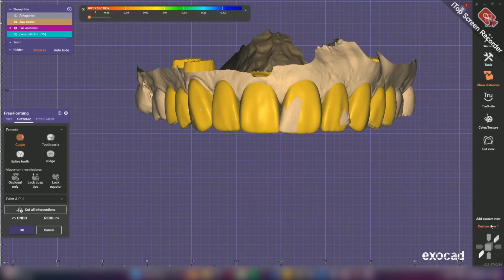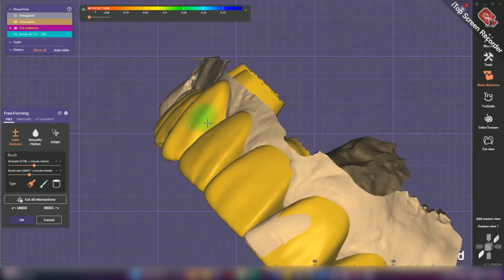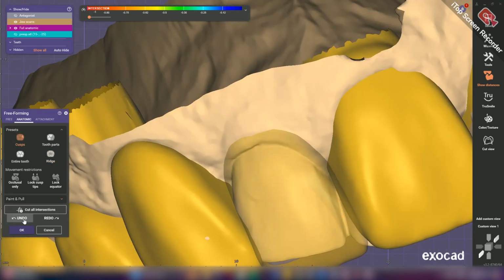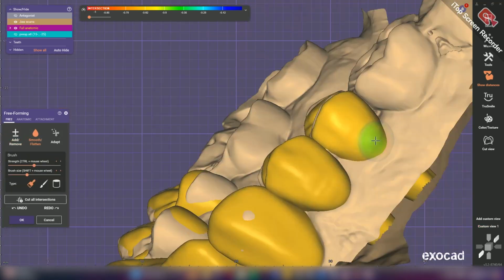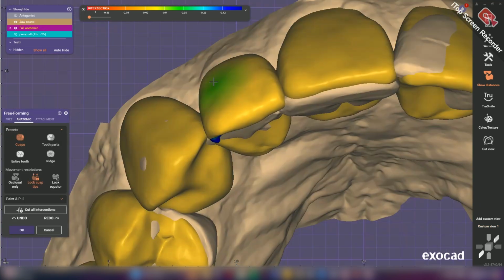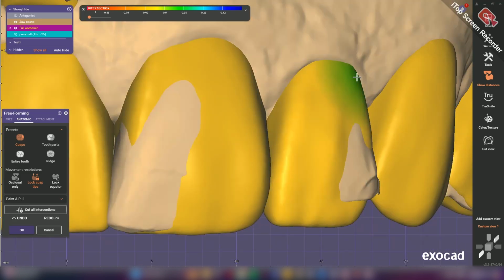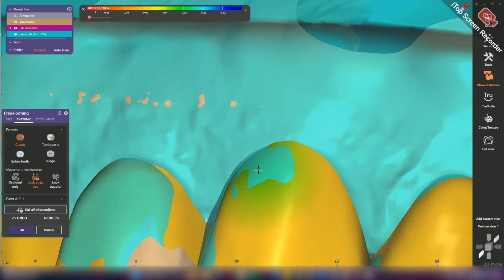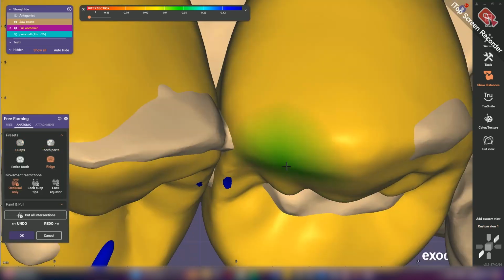Set the orientation view as facial view and see if there is anything missing, or to improve on buccal aesthetics, try to reduce the bulkiness of the buccal if some contours are too far out. Fine-tune them using the anatomic presets functions and make sure they block out all the triangular open embrasures that will prevent food traps. Check the zeniths. Ratio of the gum lines, its heights, and its angles, every factor affects cosmetic aspects. Again, in case some of the occlusion might have changed during this whole process, double-check the bite and occlusal adjustments.